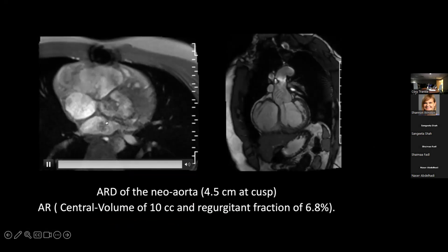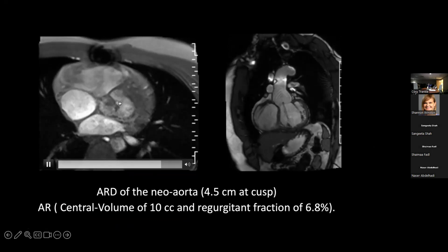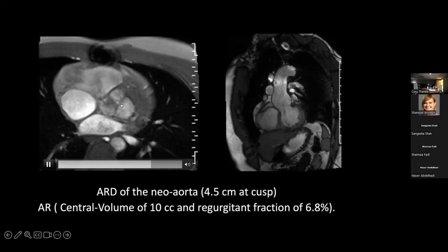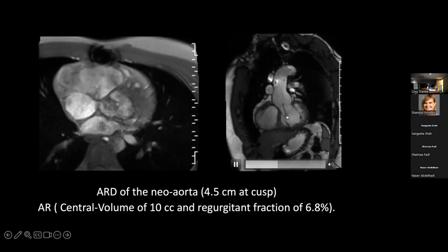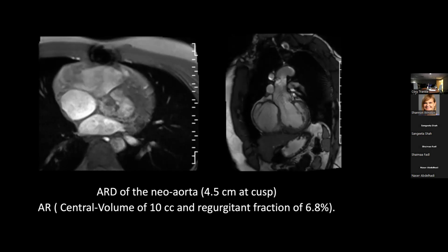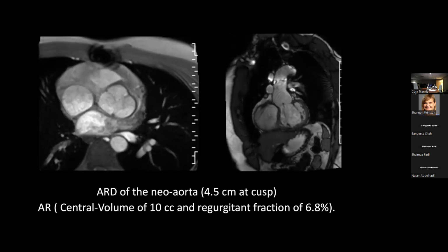But there was aortic root dilation. It measured like 4.5 centimeters. And you see here the central aortic regurgitation because of the lack of coaptation. And this is the coronal view of the aortic root, and you can see the aortic regurgitation. It was a mild regurgitation, 10 cc with a regurgitant fraction of 6.8%.